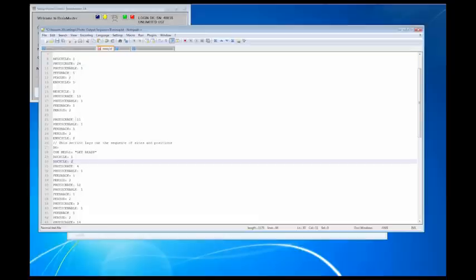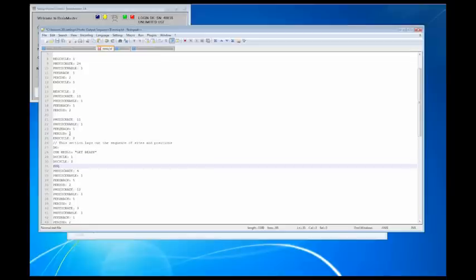It's going to go for 2 seconds. Then after that 2 seconds, we're now going to go to cycle 2, which is going to go at 10 hertz with it on for 2 seconds. Then right after that, it's going to go to the rate of 11 hertz, and it's going to be on with feedback and 2 seconds. So you can make personalized cycles. And let's just say you wanted to do that again.